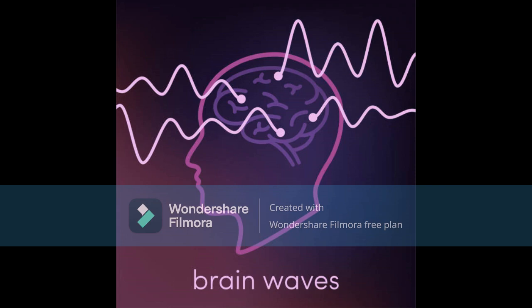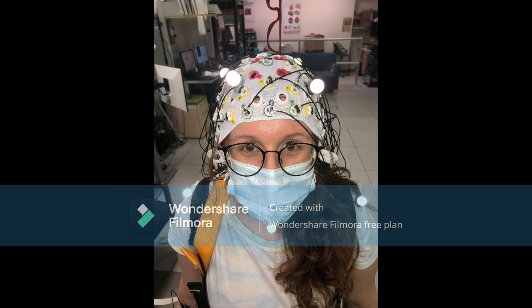Hi guys, so for my project, I'm going to talk about how electroencephalography, or EEG, works. We talked about this earlier in class when we were discussing methods in cognitive neuroscience. So this is an example of an EEG cap. Here's me in the EEG cap with some other equipment on.